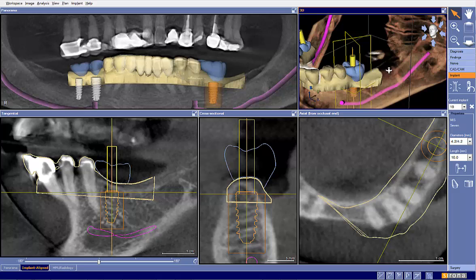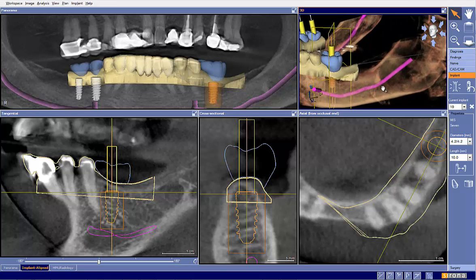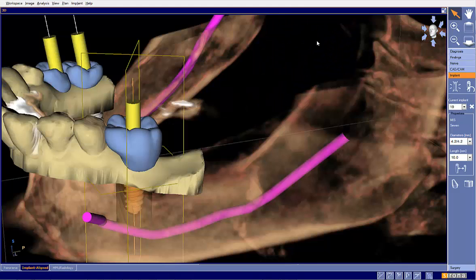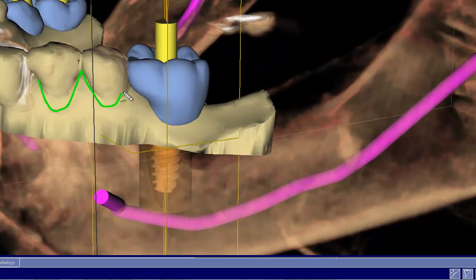Next thing I would have questions on are the bone level position. Here we can see a couple of things. One is if we look at our emergence, it comes straight out, so that's usually not typically what we want to do. So the implant would need to be placed deeper, but the real problem here is actually the manner in which we drew our CEREC margin, which would also indicate why we got such a big CEREC proposal.